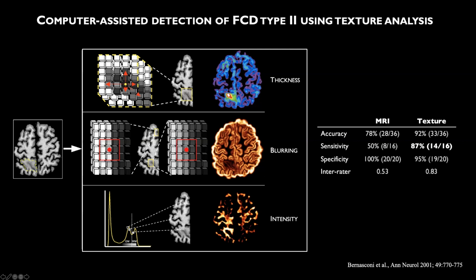Using the relative difference allows analysis of voxels located within the cortical gray matter in which the intensity is higher than normal and overlaps that of the white matter. Notably, a hyperintense FCD has intensity characteristics similar to the gray-white matter boundary and appears bright on the map.